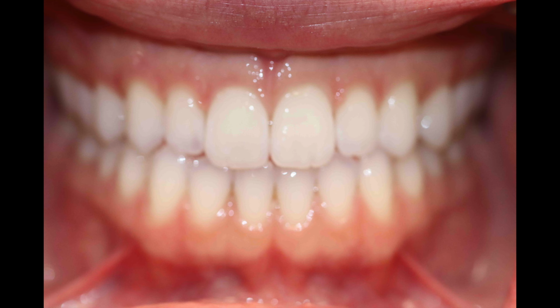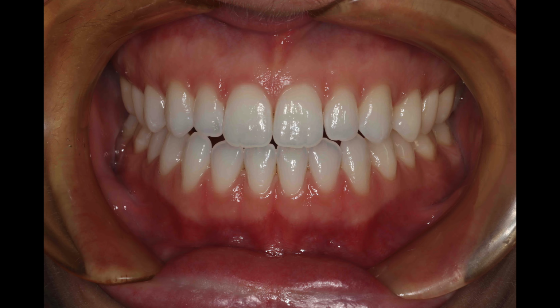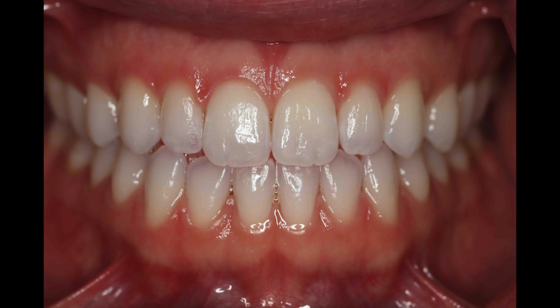This next photo demonstrates what happens when the camera is set on auto. Notice that all of the teeth are not in focus. The photographer used the incorrect angle in this photograph, and in this image, the camera was set to the wrong aperture.